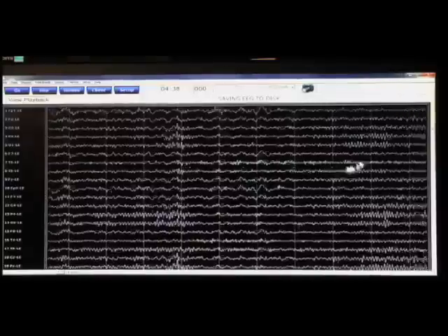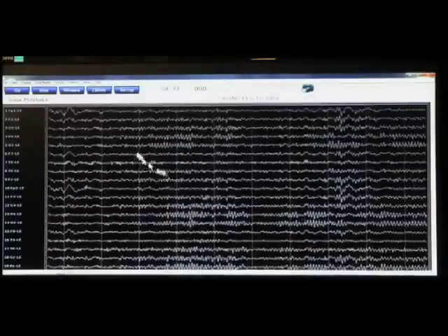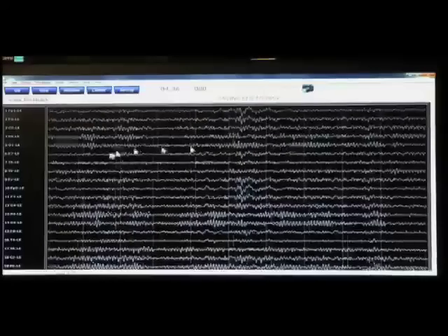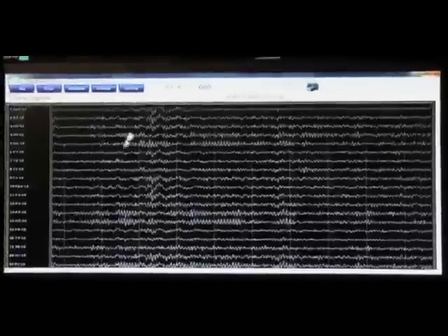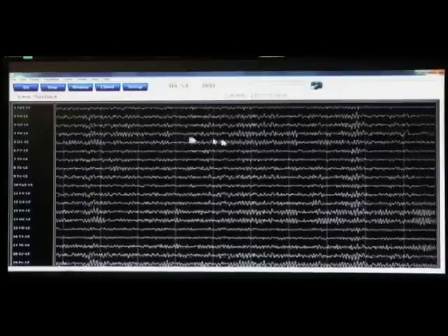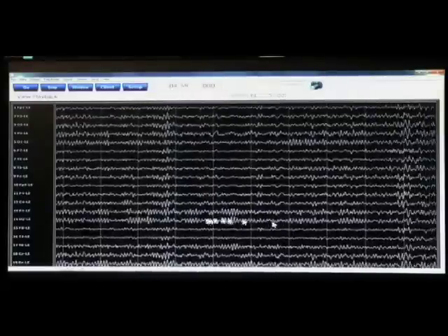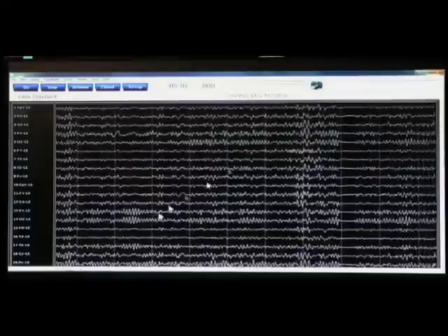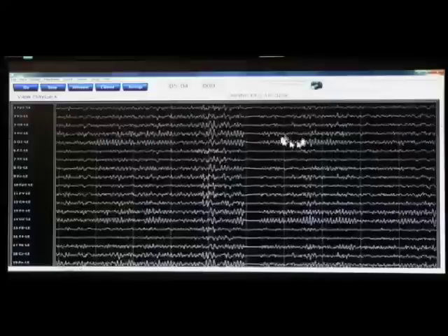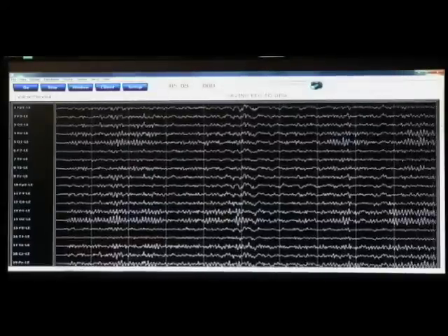This is the client's EEG here, and we see the characteristic waxing and waning patterns of the signals coming and going. In particular, because this is an alpha-rich recording, we look at P3 and O1, where my mouse is right now. P3 is up here, O1 is here. And then down on the right-hand side, we have P4 and O2 here. And you can see that there's a predominance of activity at P3, O1, and at P4 and O2, so that we also see in the Loretta that there's a posterior source here.